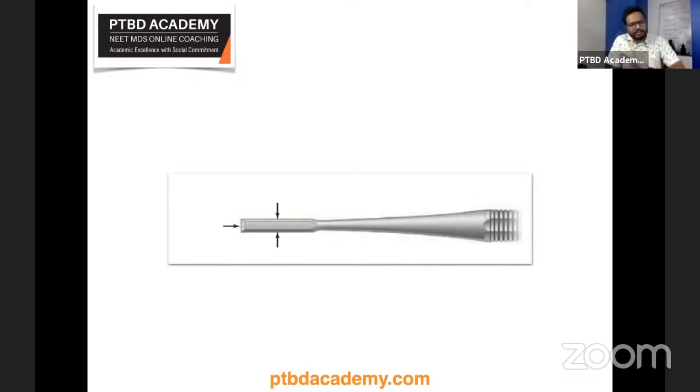So this instrument is a chisel, a carpenter's tool, which I'm sure all of you have seen and have used during your undergraduation. So it's a chisel. As we discussed, the cutting edge is perpendicular to the blade, so we omit the cutting edge angle in such cases. So it has only a 3-unit or 3-digit formula.